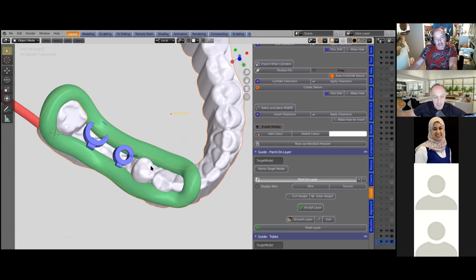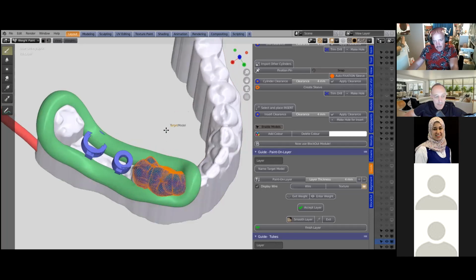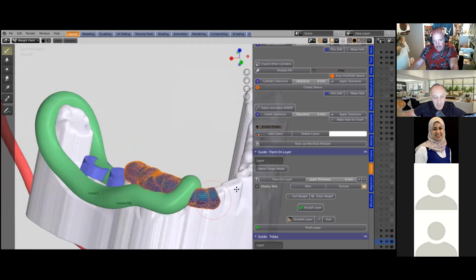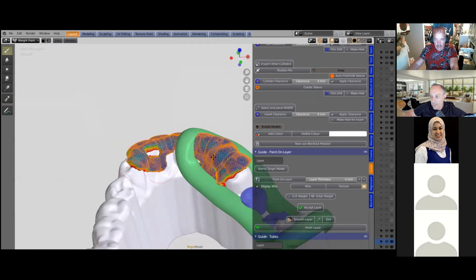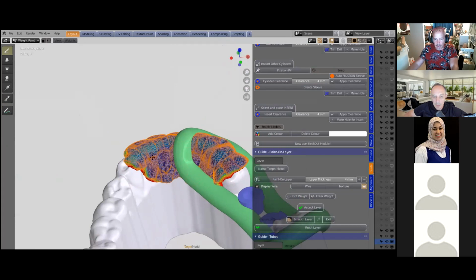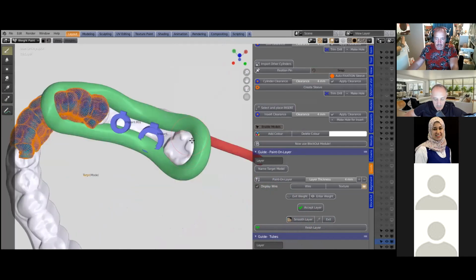Just wait for it to come up here. Okay, so let's have both versions. So we can extend this even like that. So we are very flexible. The creation is completely up to you, what you want to do with this. All the tools are there. Let's put a dot on here, for example.